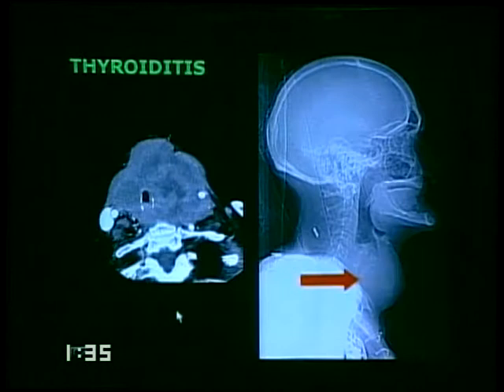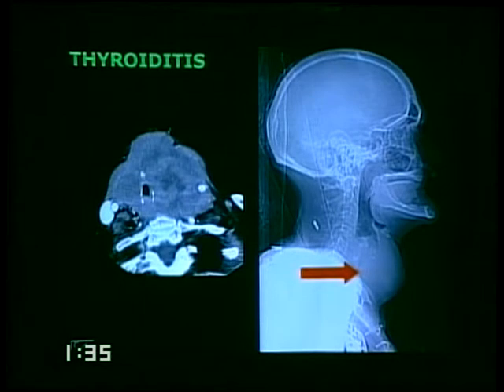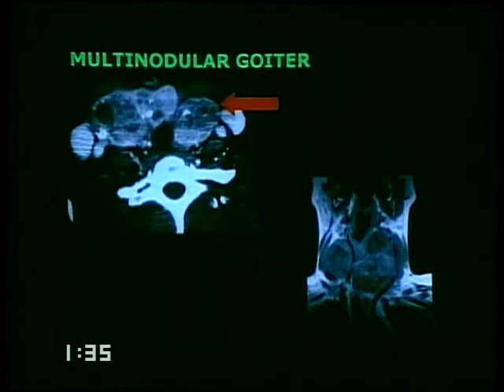Going on to cross-sectional imaging, again, large tumor, it is surrounding and encasing the upper part of the airway. Very suspicious for thyroid cancer. Very heterogeneous, liquid areas, few areas of calcification. Clearly almost as big as a face, but this turned out to be very aggressive thyroiditis. So cross-sectional imaging is not going to really show you what's going on.